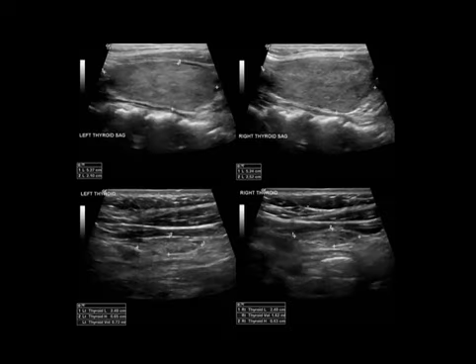They were treated with radioactive iodine, and what I want to show here is how the appearance of thyroid changes from before I-131 treatment for Graves' disease to after I-131 treatment, where you can see that the left lobe of thyroid has shrunk, decreased in size significantly, and so has the right lobe. The patient became hypothyroid, and they were started on Synthroid.